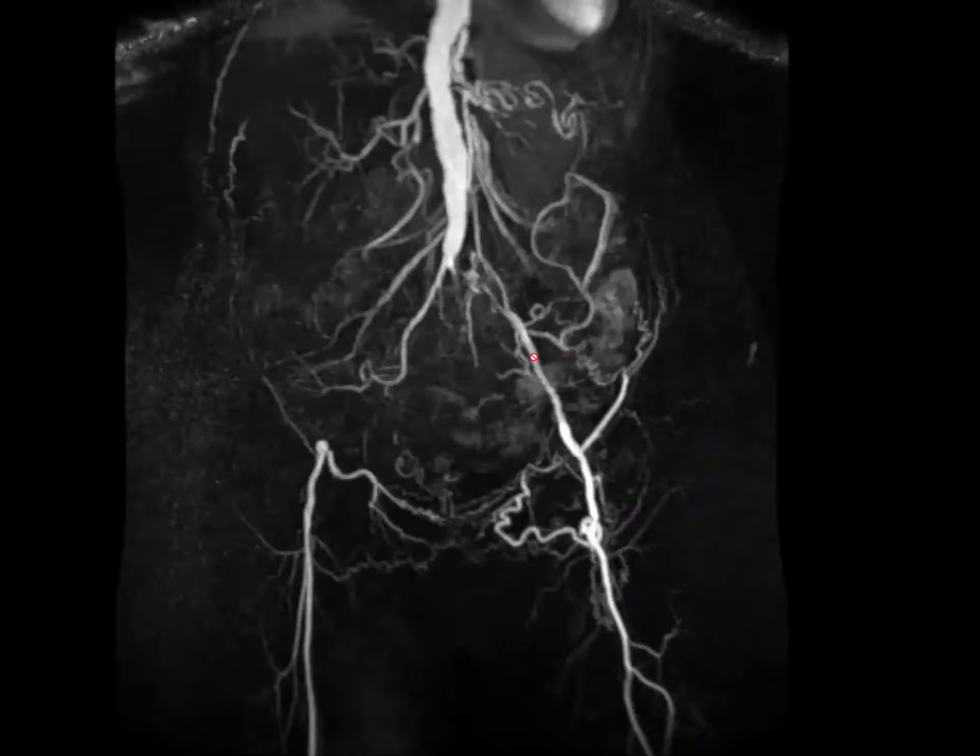Okay, we're going to move. So this is the arterial sequence. And then just to make it a little bit easier for everybody, I'm going to share this image. Looks like Leriche. That is correct. This is Leriche, exactly. The other interesting thing about this case, this was a lady in her 70s. She came to us recently. This is the only imaging that we have for her.